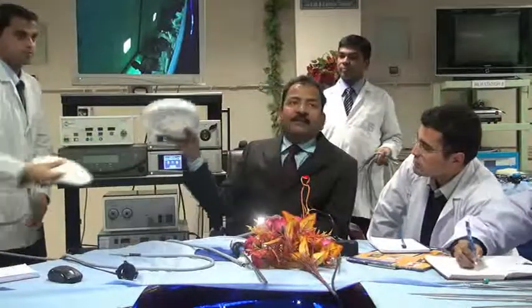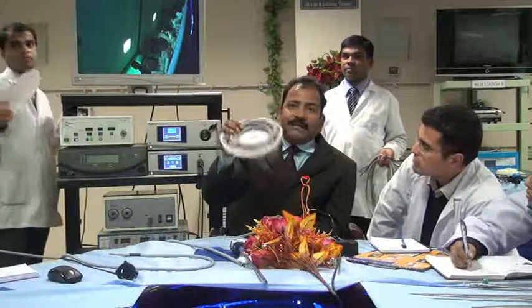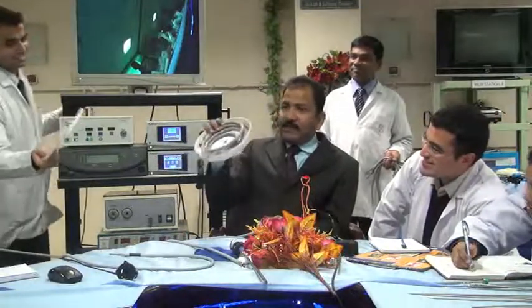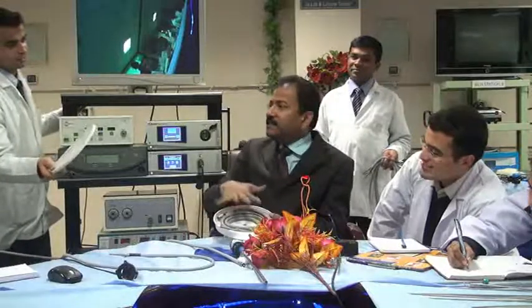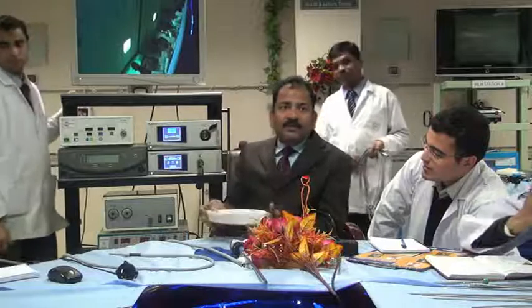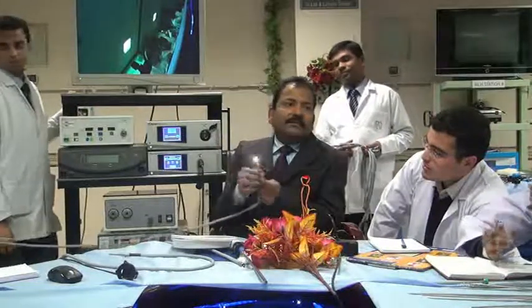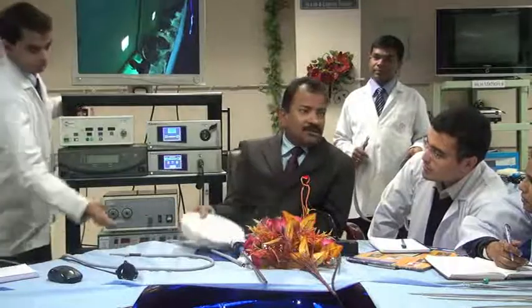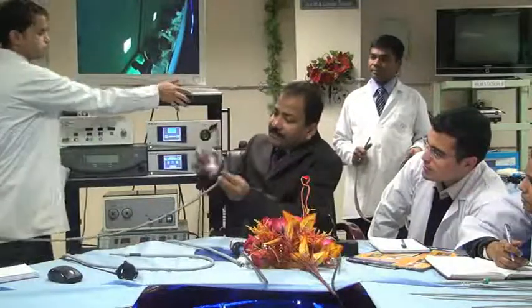You should keep your light cable just like how you keep your snake box. It should not be less than 8 inches in diameter, and it should not be bent acutely. If someone bends it like that, he is your enemy. So it should be not less than 8 inches, it should be like that.